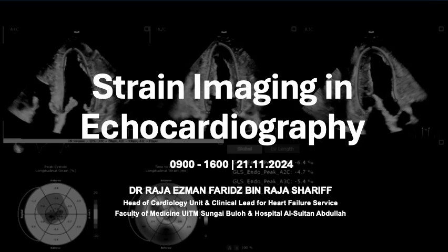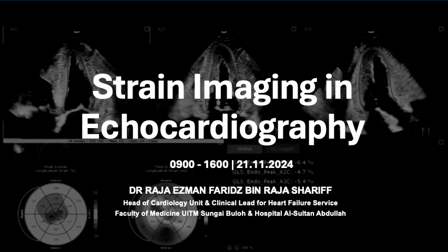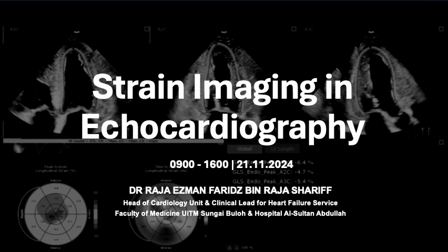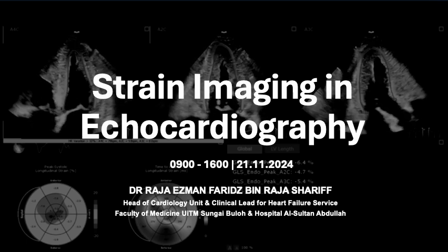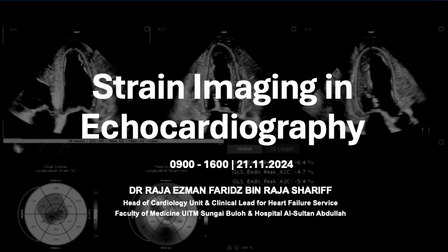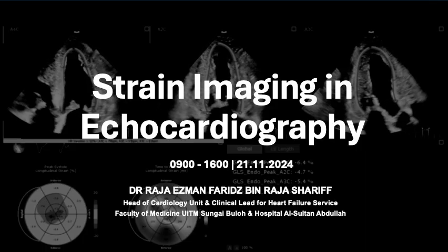Have you ever seen it before? Okay, so this bullseye plot, people will talk about cherry on top and all that. You hear this over and over in certain cardio conferences lah. So that's what we are using strain mostly for, pattern recognition. But I will go through the different utilities of strain imaging. We are not here to make you strain experts. We just want you to appreciate where best to place strain in your clinical practice lah.